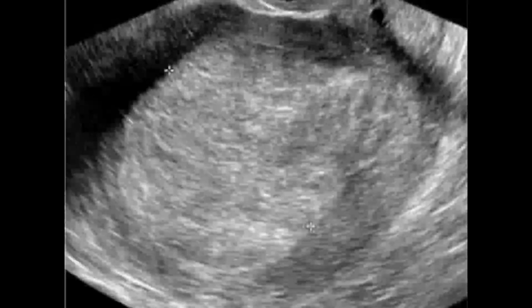So these two could be on the top, and if the patient has any history or is a candidate for carcinoma, you can still think of that, and for that you need to have FNAC or curettage or biopsy to confirm these things. In case of metastasis, there may be a history of ovarian or fallopian tube or cervical carcinoma.